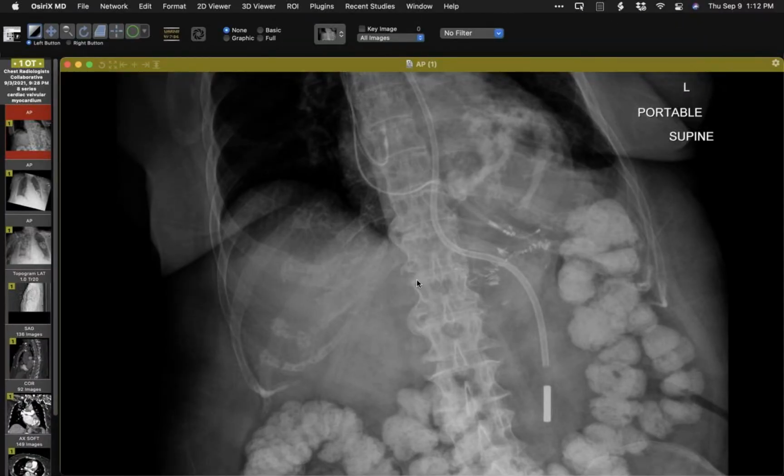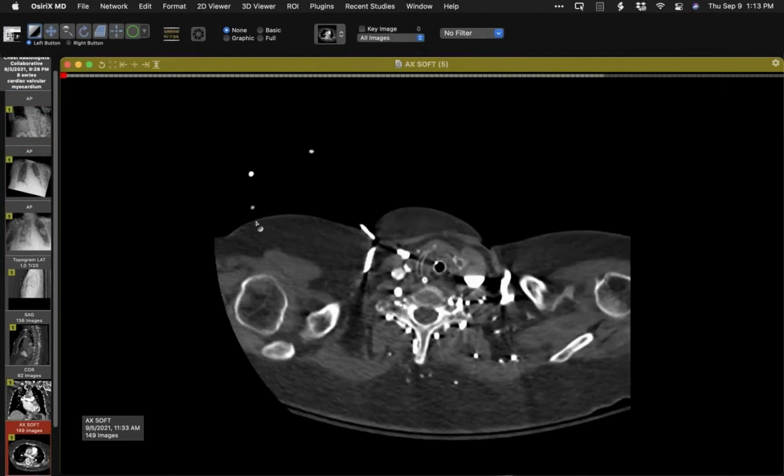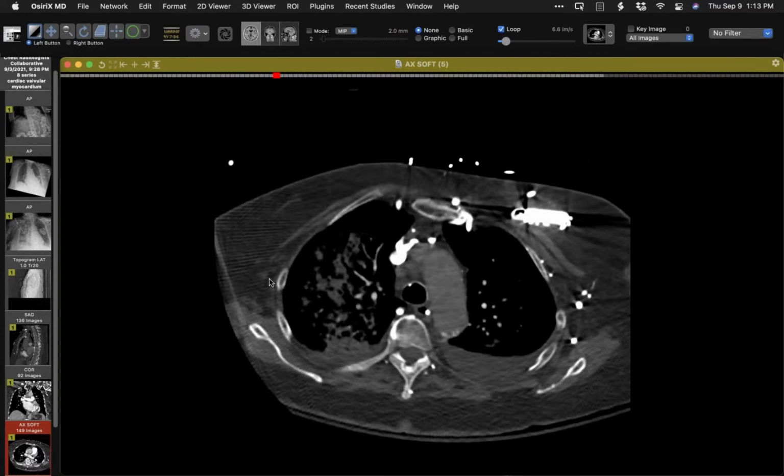Here's a really interesting case in which an unexpected finding is present. Patient has a complicated history, but at least at this time, there isn't a primary cardiorespiratory illness involved. So we have pacemaker leads, a feeding tube, contrast medium in bowel, and surgical material in the upper abdomen. And of course, this is the rather unusual finding on the radiograph. And it turns out to look like this on the CT. I'll skip by this only to say that we thought this was a bronchopulmonary aspiration episode.